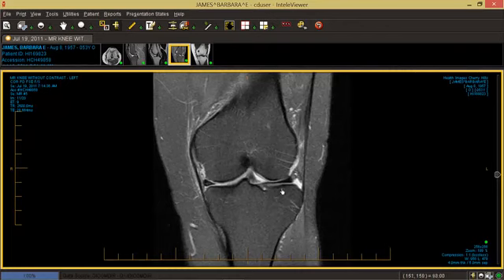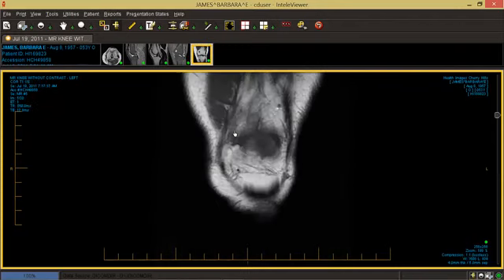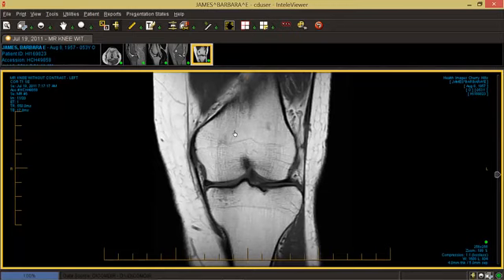And so what do you notice here? You can also see the gray. So you've got this darker color here, which is the bone, and then the lighter color, which is the cartilage on the very end. Now, realize there are two kinds of front or coronal images here. This one where water is bright, also called a fat sat. And then I'm going to go to this one where the bone is light now. The cartilage is dark. The meniscus is about that same dark color.